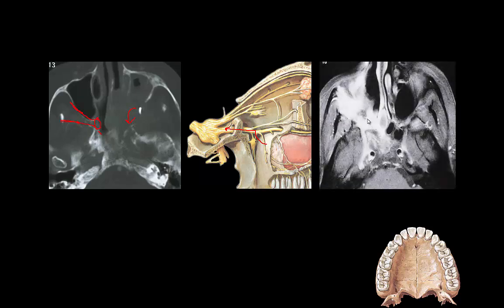Now, if indeed the tumor is located to the hard palate, remember the one I showed before, they could do a maxillectomy. But on the other hand, if we as radiologists say the tumor is in the pterygopalatine fossa, and now there's retrograde perineural spread along V2, and this is foramen rotundum into the cavernous sinus, at most institutions now, this is not being treated with surgery, but with chemotherapy and radiation therapy.